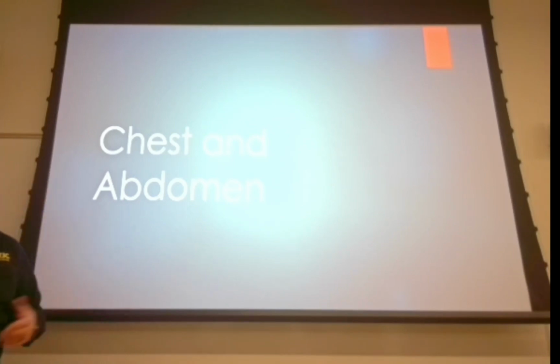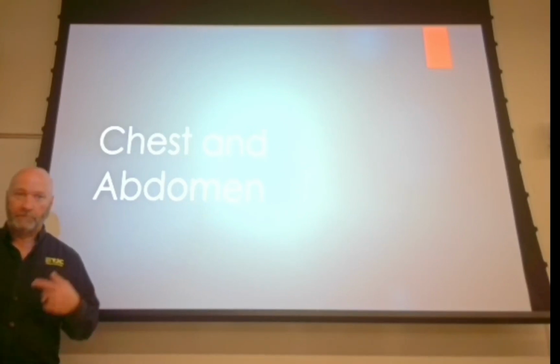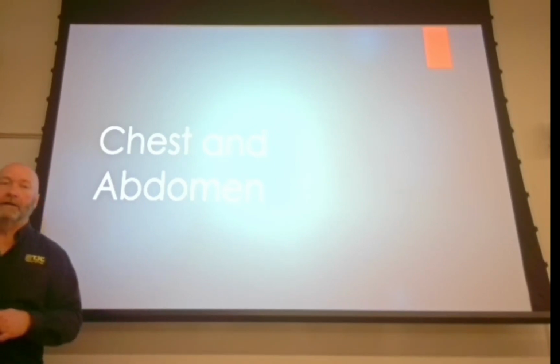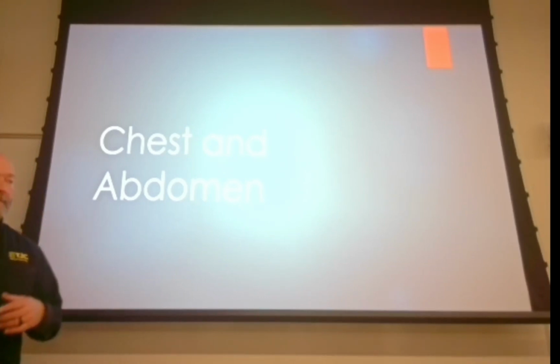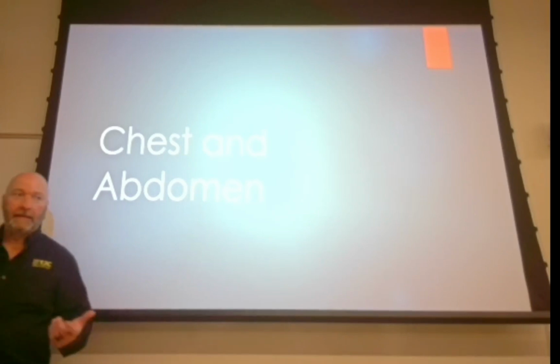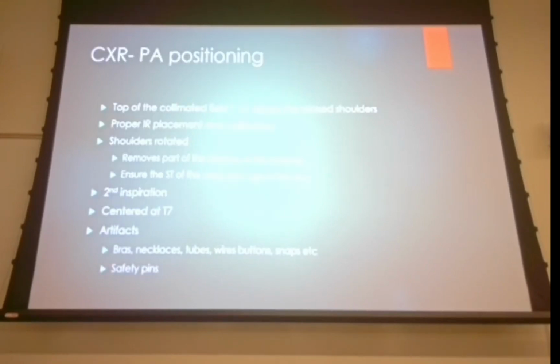So some of the things we're going to talk about are things to learn from and then not repeat on future exam types. So not all the images are bad. Even the bad images, not all of them, depending on patient condition and what the problem was with the image, not all images would I repeat. As a matter of fact, most of them I would not, depending again on what the patient's condition is. So we've got some bad images in here that we'll look at and talk about whether or not we would repeat those, whether or not we should repeat those, and how to correct the things that we did wrong.